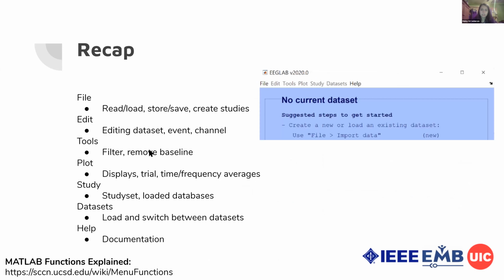Just in case you forgot, or if we didn't go in depth on it, I want to touch base on the little menu icons at the top of the EEGLAB GUI. These are what they all mean. If you're looking to do something like remove noise, then you know generally where to go based on what these individual things do.